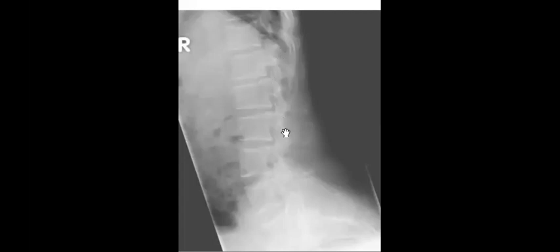Caudal narrowing also of the interpedicular distance. Okay. If he shows you the pelvis, then maybe you can talk about the tombstone iliac wings and champagne glass pelvic inlet.